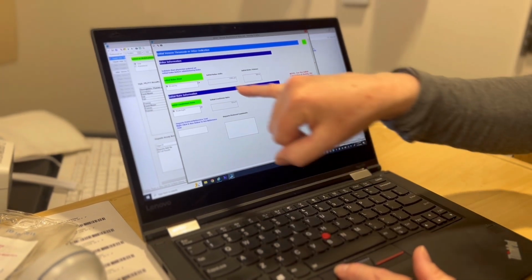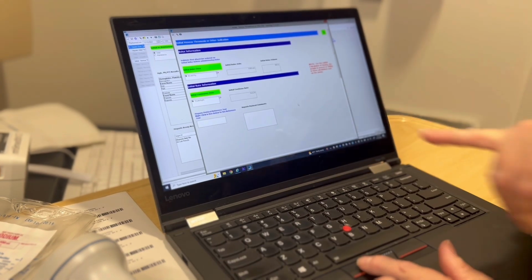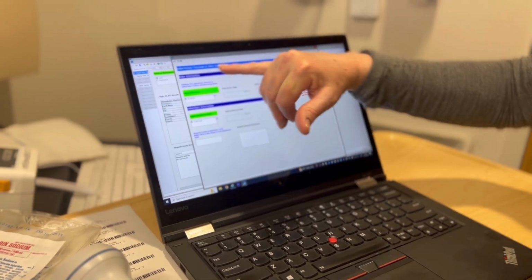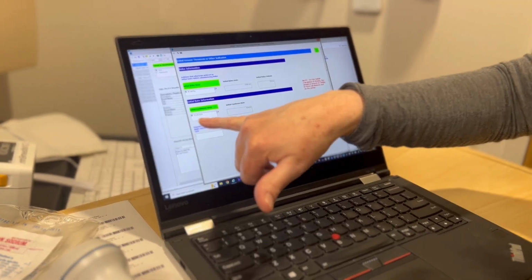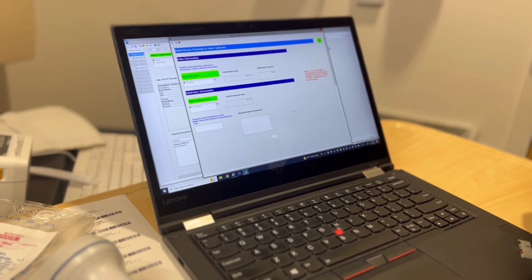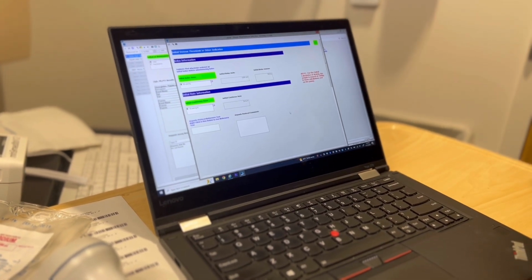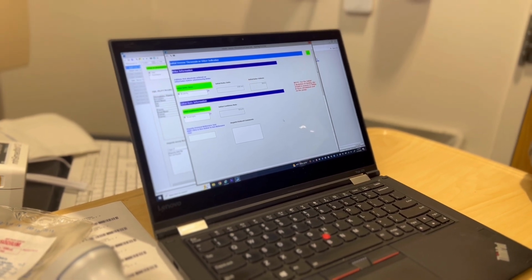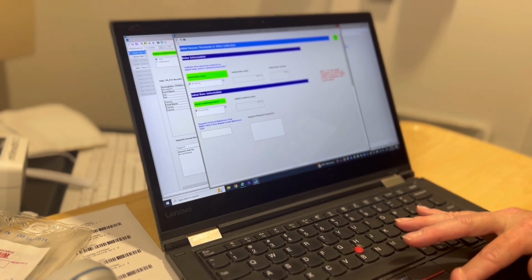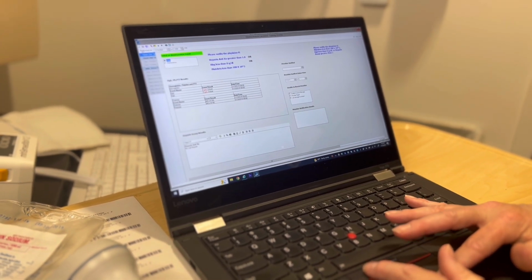This screen is basically telling you that I have chosen initial bolus and that I have a continuous dose. Our continuous dose starts at 18 units per kilo per hour. So you need to make sure it's defaulted here. It's going to tell you we're giving a bolus of 80 units per kilo and I'm starting at 18 units per kilo per hour. Notice nowhere in here does it give us milliliters per hour. We are not doing rate, we are doing dose. So once I've looked at this and validated all of that, I am just going to refresh, and then I'm going to hit my little check mark.